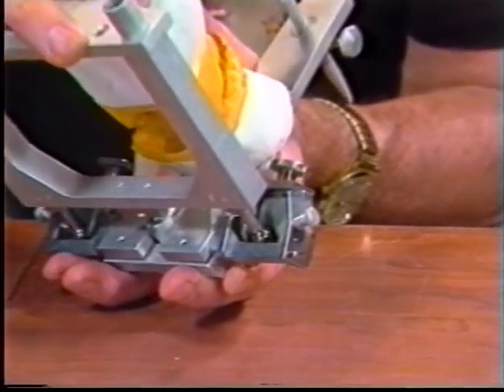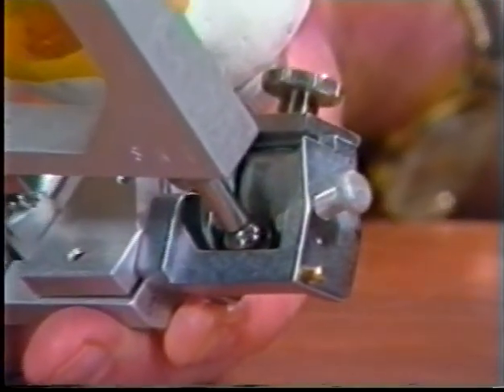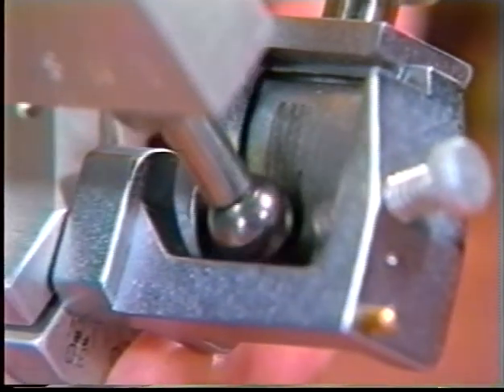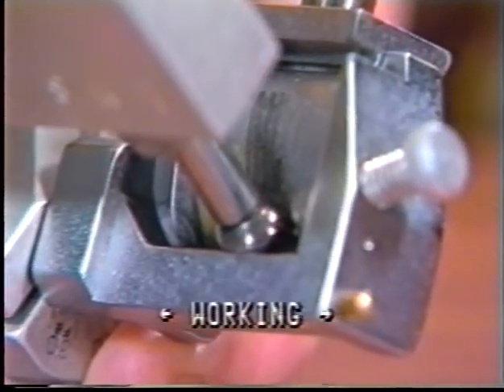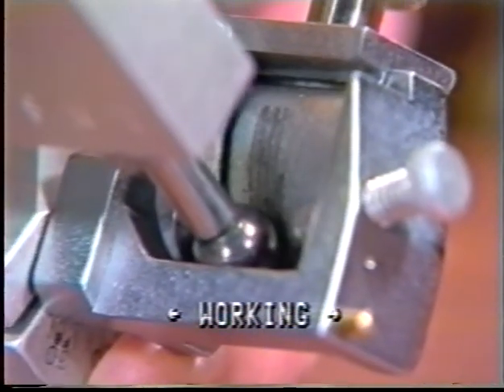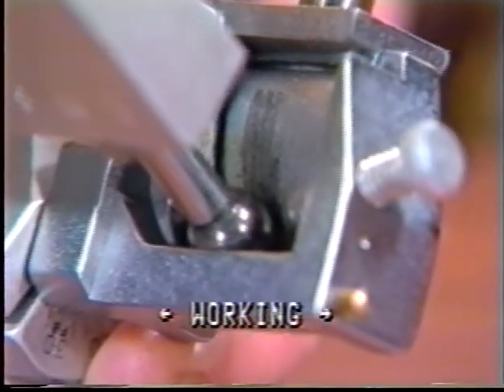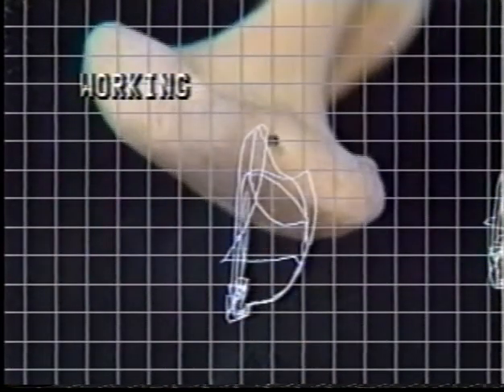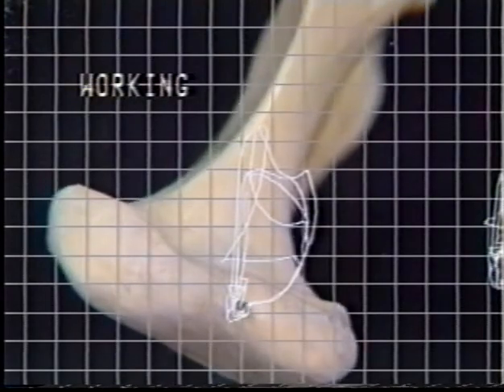Here we see an example of an articulator adjusted to allow for an extreme amount of working side Bennett movement. For most people, this movement measures less than 1 millimeter. This is the subject with the severely worn teeth. He has an extreme amount of Bennett movement.